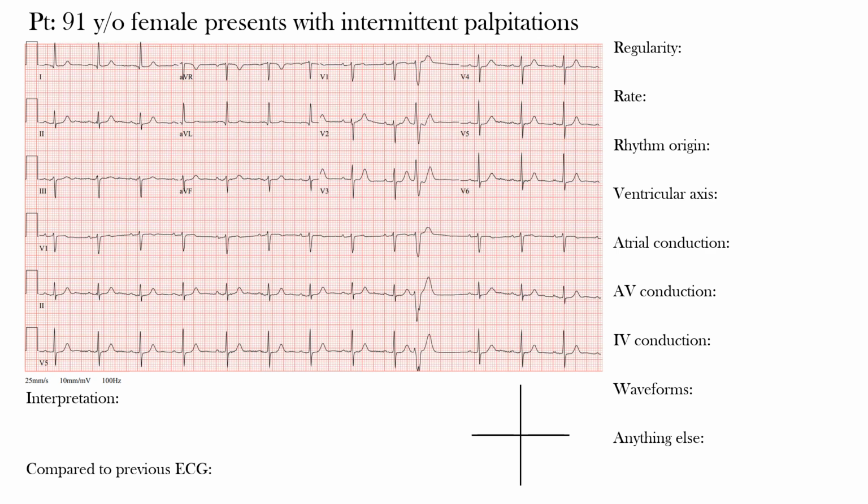Now I want to pause the video and I want you to take a few minutes to go through the EKG yourself. Try to answer different areas of this, okay? And then when you're ready, start the video and we'll go through it together. All right, so our 91-year-old female that presents with intermittent palpitations in this EKG. So now let's walk through it.